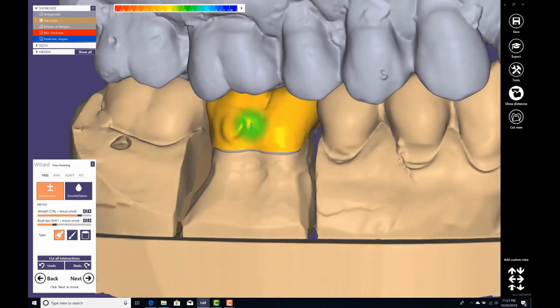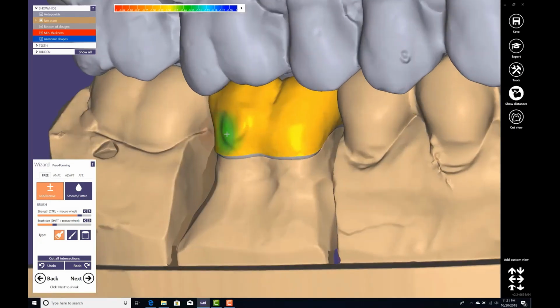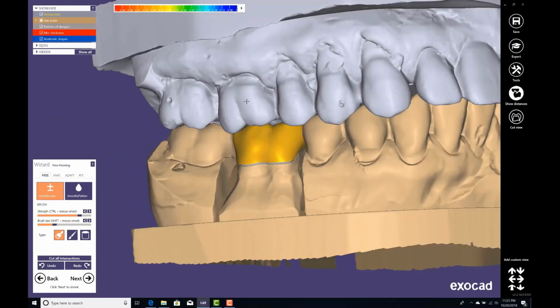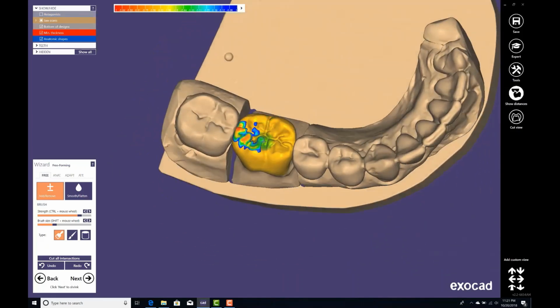But let's say now I want to smooth, because I don't like this little bubble I have here. By clicking Control and Shift, my brush now becomes purple. So Control Shift and left button, and right now I'm smoothing. It's a pretty good tool which I suggest you use, because it makes your design life much easier and faster. You can have a really good workflow.